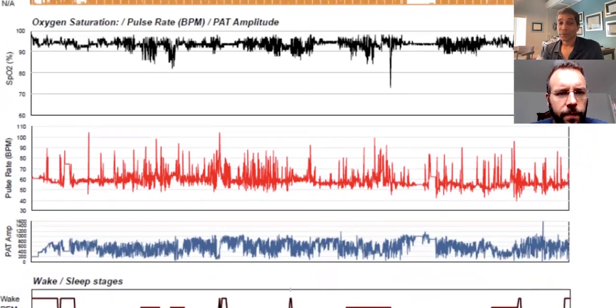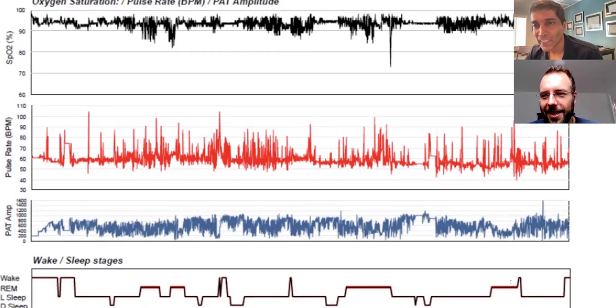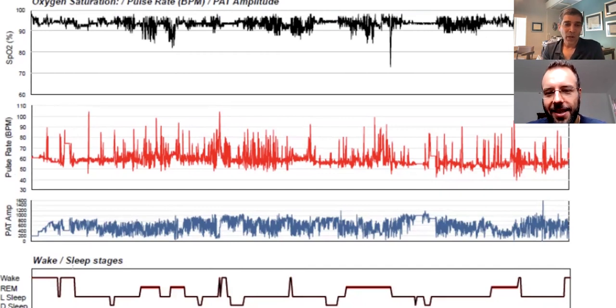But here you go, here's the Andrew special. They don't wake up that much. 1, 2, 3, 4, 5 awakenings during the night. Just 5, right? And then how many cycles? 1 cycle, 2 cycles, 3 cycles. That's not terrible, but 4 to 6 is better. And then they woke up out of deep sleep 1 time. I mean, meaning REM 1 time, and slow wave sleep 0 times.